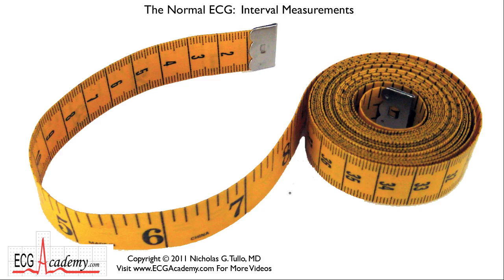Hi, this is Dr. Nick with the last chapter in this section of the normal ECG. We're going to talk about measuring intervals because this is one of the first things that we do when we're trying to interpret an ECG.